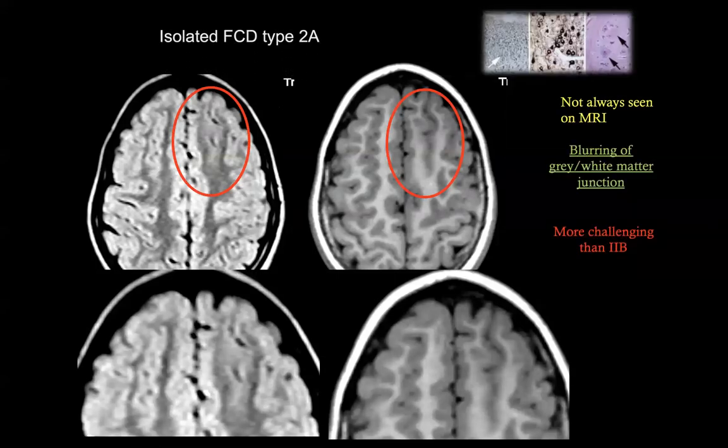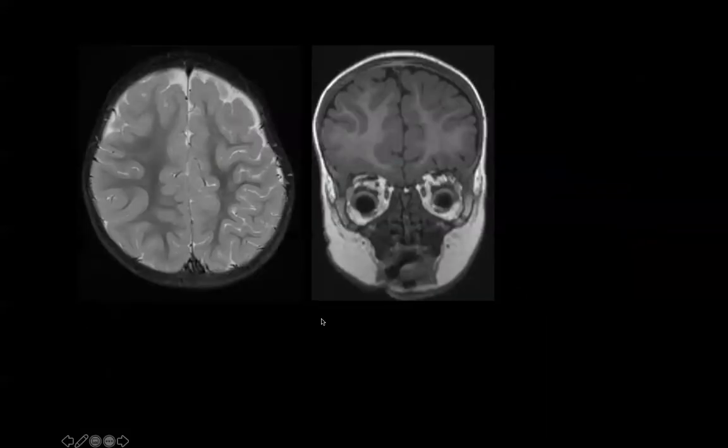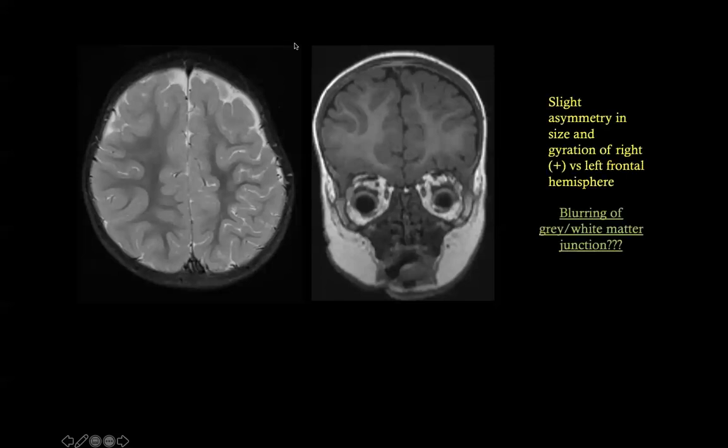can look like that. And remember that you don't have the hyperintense subcortical signal to help you out. This is even more difficult because there is a bit of blurring here. There is a bit of asymmetry. You see here is larger than there, but I have to say that 2 neuroradiologists reported this as normal. And actually, because we were helped then with the EEG and semiology, we decided that this was abnormal.